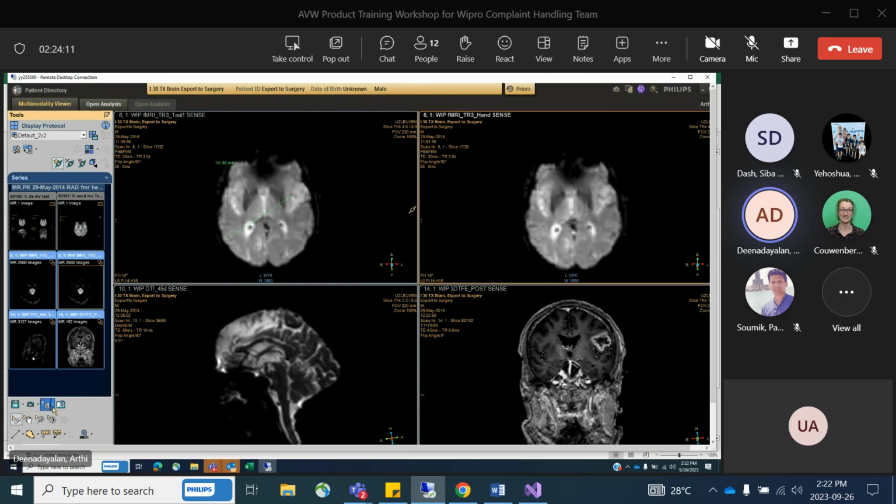Same way as for the reporting tab. Send selected image to report, send display to report, send results to report. So I can select one image, click on send selected image to report, and you see a similar icon on top. Click on that icon.